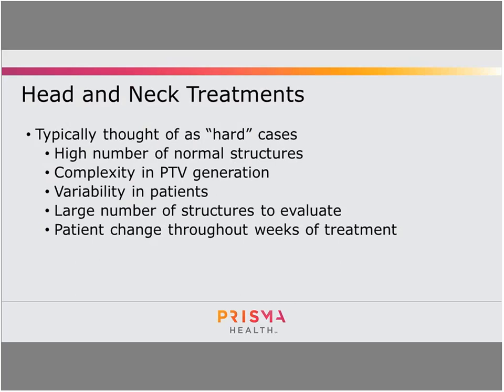These PTVs are going to be different from patient to patient. There's typically different dose levels. And in addition to the PTVs, the patients are going to look very different. Some patients are bigger, some are smaller, some have bent necks, and there's a wide variety where pretty much every patient's going to be unique. It's hard to apply the same solution to every case.